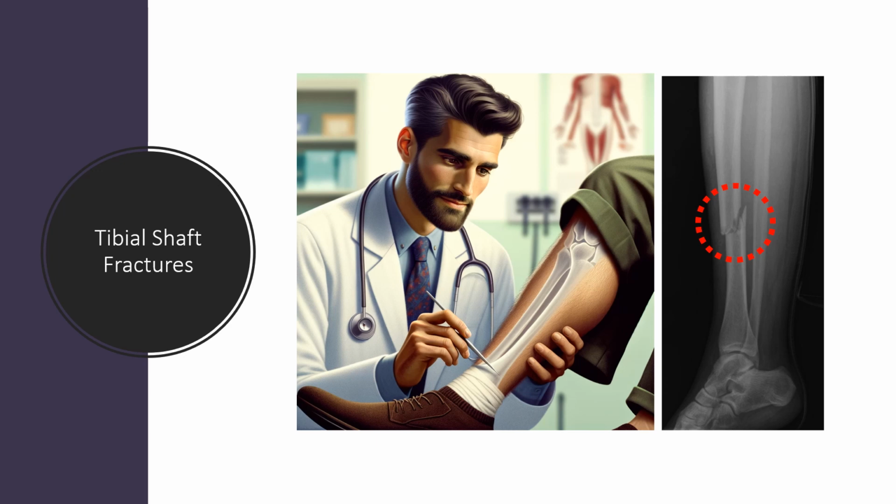Treatment depends on the type of fracture. Closed, non-displaced fractures may be treated with a long leg or above-knee cast. Orthopedic referral is needed for displaced fractures, open fractures, or those with neurovascular compromise. On this X-ray, we can see a tibial shaft fracture.